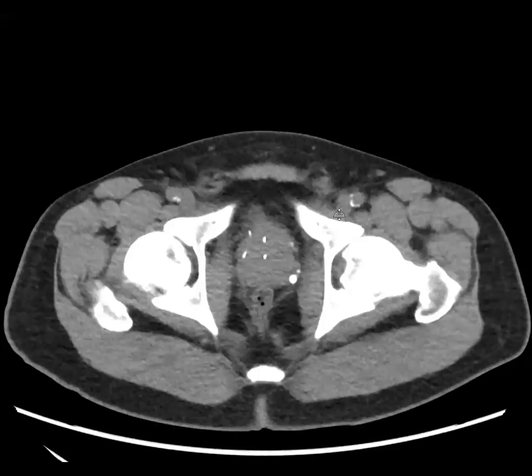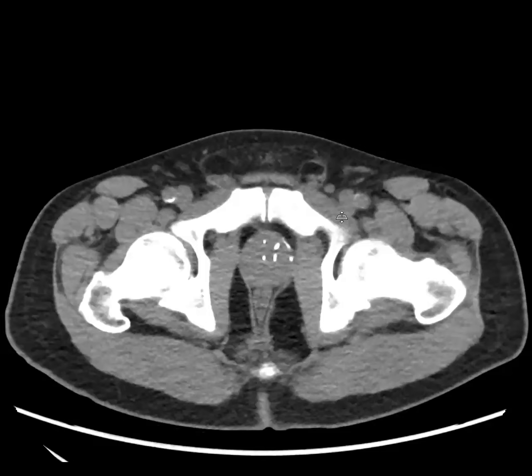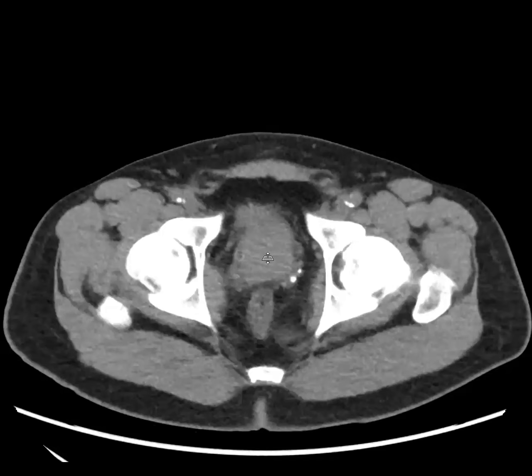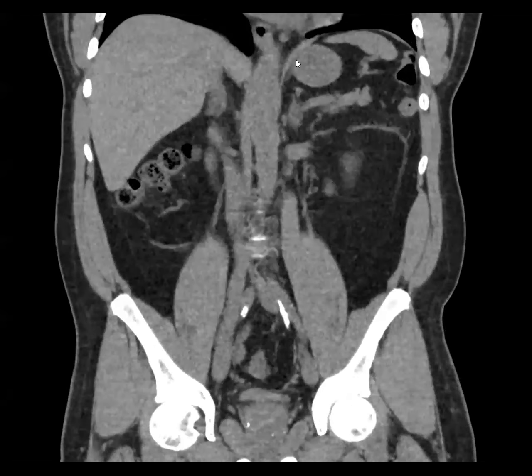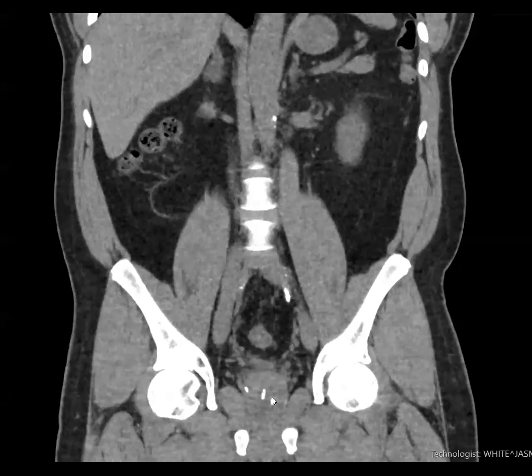Okay, Nelly, what do you think about this prostate? There's UroLift clips in there. Yay! So this is just a shout out for UroLift. When we see metallic things in the prostate, we often think about brachytherapy seeds. But if you see there are only two sets of them, two sets on the inside and two sets on the outside, that is a UroLift procedure, which is for BPH, where they try to pull apart the prostatic urethra using this UroLift device.